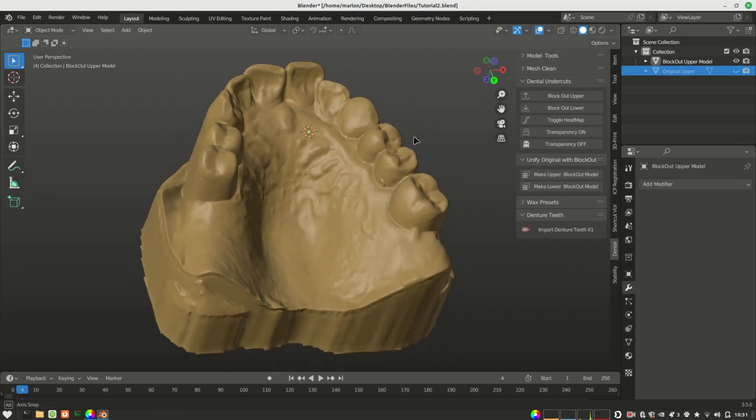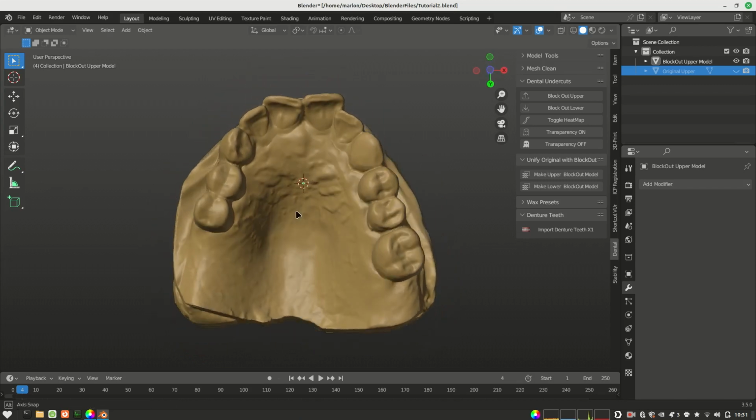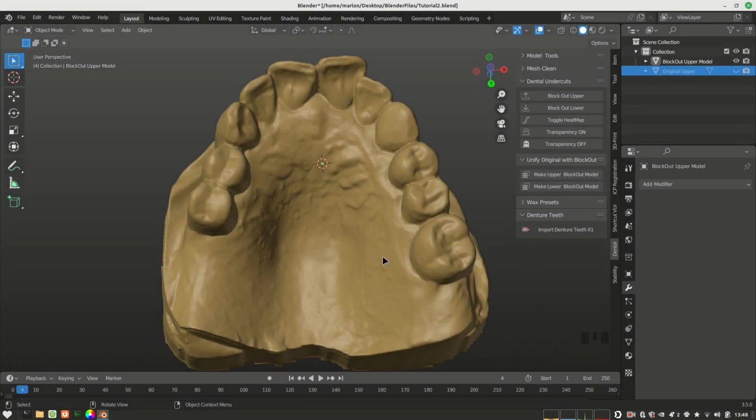So now we go into making the partial. During this section I will not talk too much, so if you want to follow along, open up your own blend file with your own model and maybe try to replicate something similar to what I'm doing. I will try to indicate with a mouse pointer. You can always look at the screencast for which buttons I press, and I will just point out a few things here and there, and let's get started.